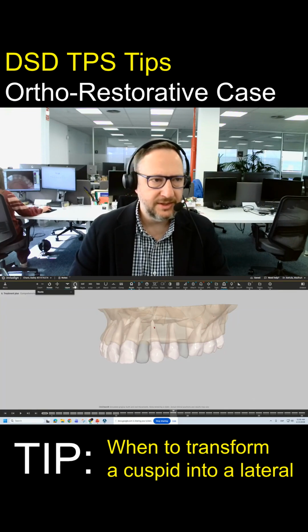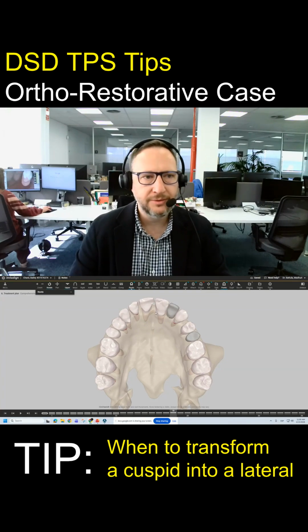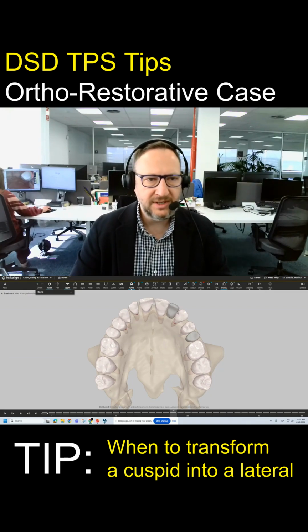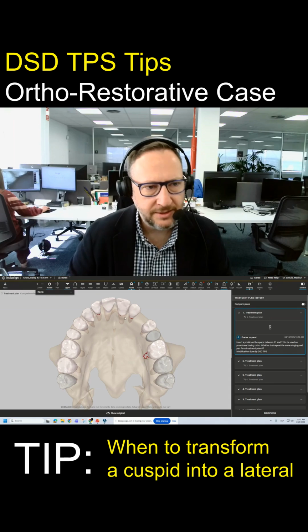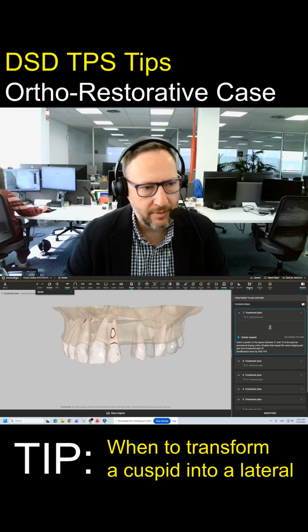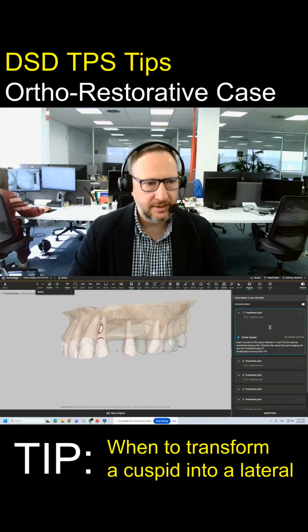Okay, so the decision-making process here was, since the patient will require restorations anyway, and she has small crowns that we will be increasing teeth size and improving the proportion, to move mesially, as we are going to show you now, like you're seeing here, it's going to be much more predictable. Okay, from this to this, I'm not moving the roots so much anymore. I am now tipping the crown mesially, and I am opening space to place an implant here in the cuspid area.